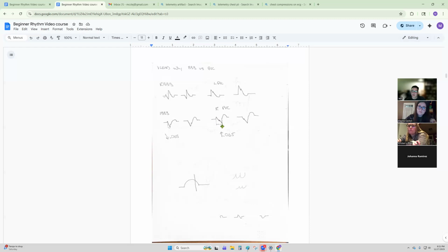What that tells you is that activation time is taking longer because it's coming straight from the ventricles. That bigger muscle mass is taking longer to depolarize. So this is called the nadir. You're going to measure a QRS at the beginning of the QRS like you normally would, to the downward point. This line right here is the measuring of the nadir.